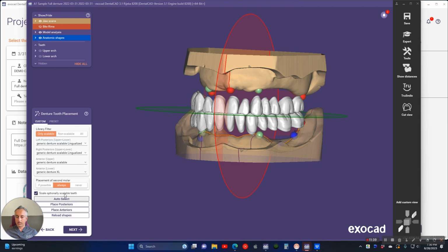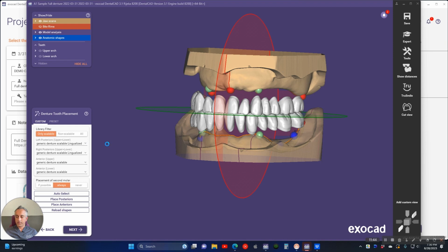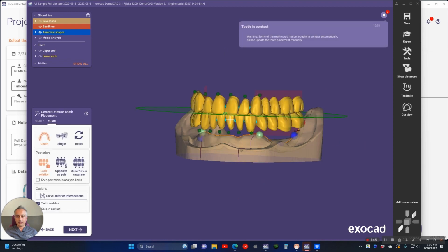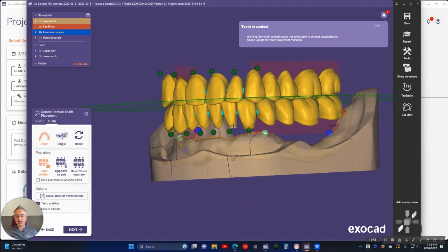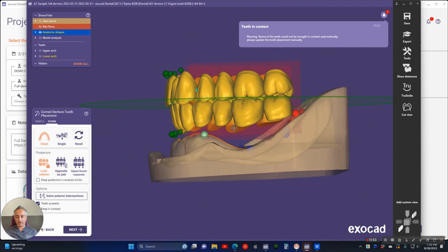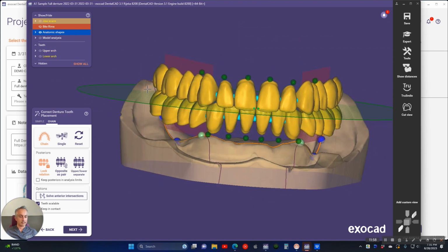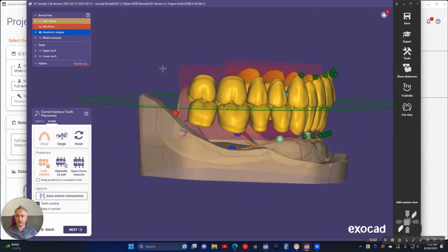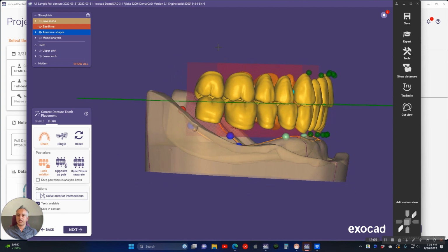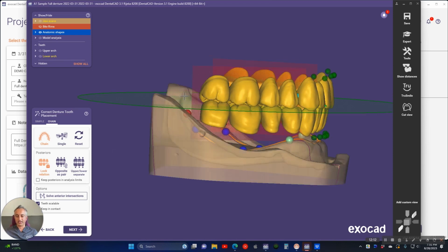And let's go ahead and continue. Now you can see it kind of reshaped some stuff. It reset everything. It's hardly ever going to get it this right for you in the future. So don't expect this. You're going to end up with some giant posteriors and tiny anteriors, and that's just the way it's going to be. It's going to require some manual corrections, and we'll see that in a future tutorial where I will use actual patient data and not this dummy textbook data, and you'll see that it doesn't always turn out like this. In fact, it rarely ever does, for me at least.